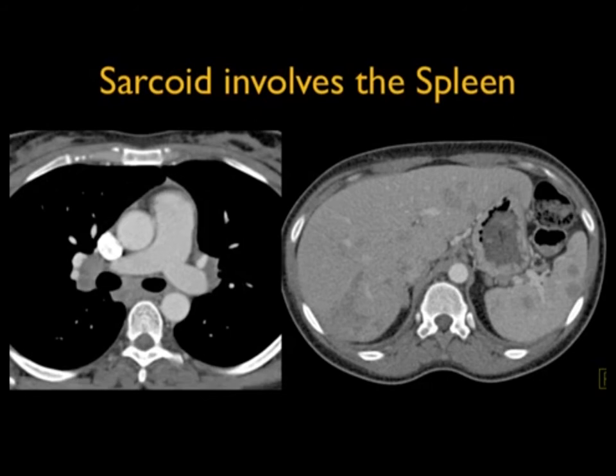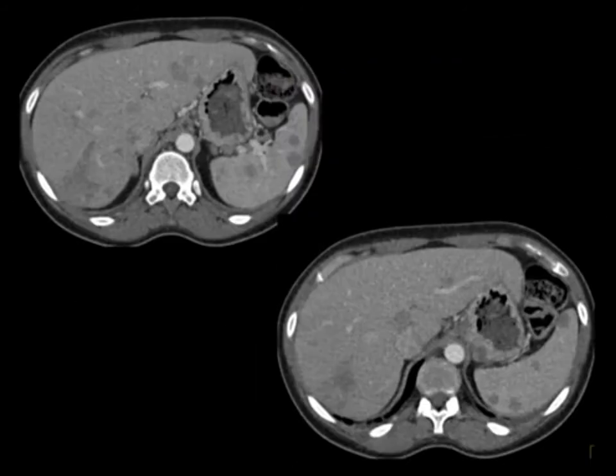And you can see here the patient has adenopathy in the chest. So sometimes you can make the diagnosis from the chest, but you can see it can be hard. If you look at this case, you surely would consider lymphoma or some malignancy in the differential diagnosis. But again, younger patient, particularly female, look at the chest, think about sarcoidosis. But you can see it is difficult.